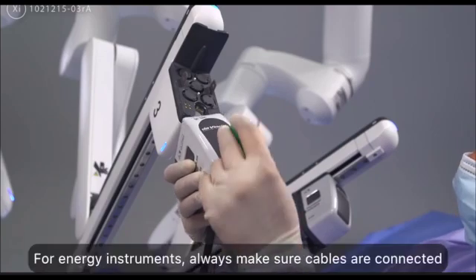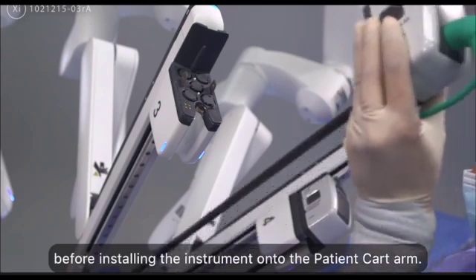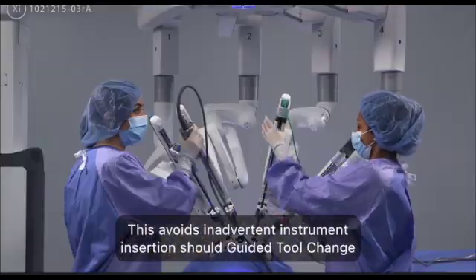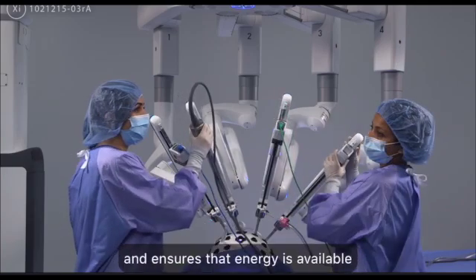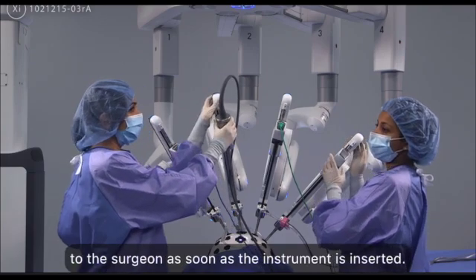For energy instruments, always make sure cables are connected before installing the instrument onto the patient cart arm. This avoids inadvertent instrument insertion should guided tool change or the instrument clutch be engaged, and ensures that energy is available to the surgeon as soon as the instrument is inserted.